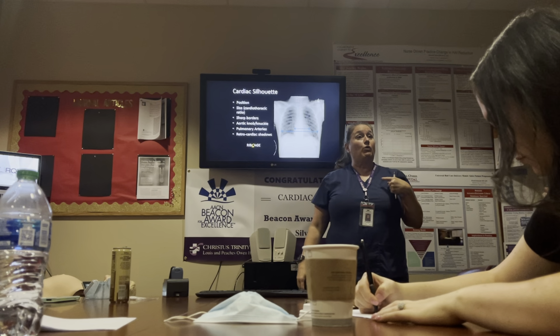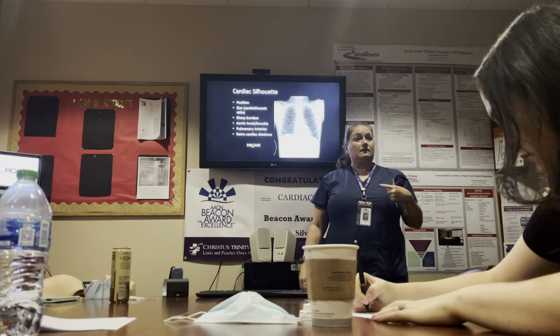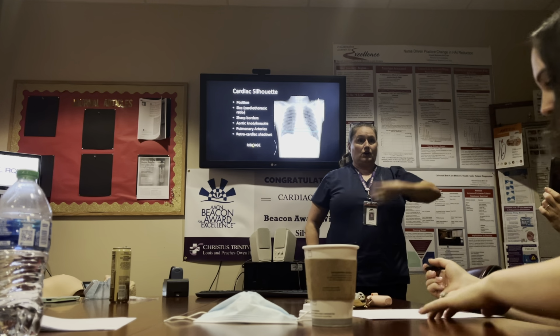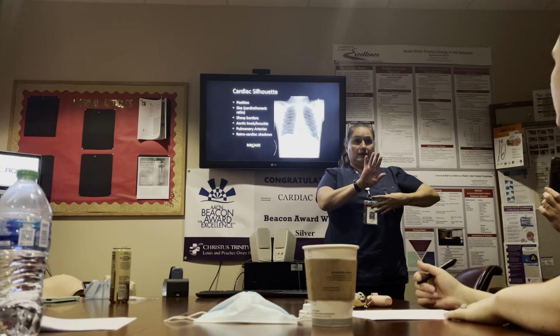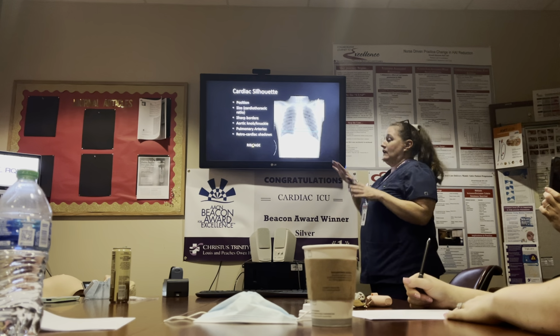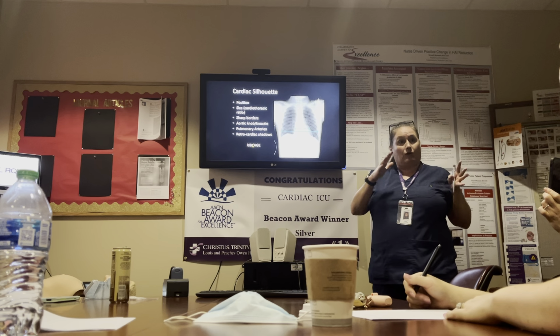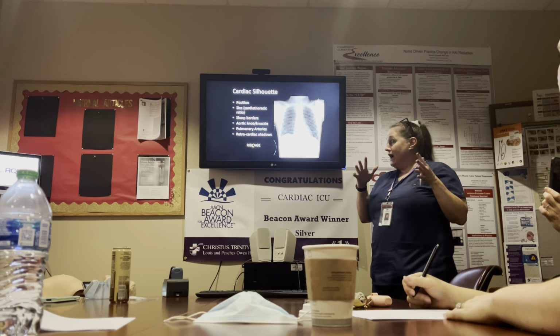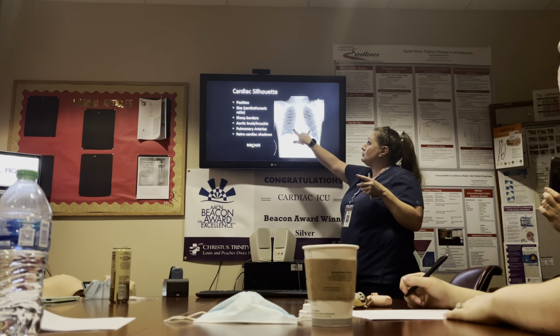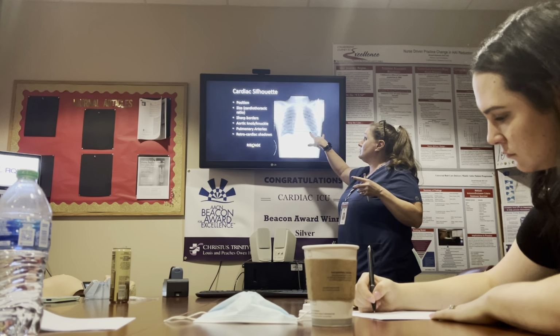When you take a regular chest x-ray, PA and lateral in the department, the plate is here and the patient is standing up against the plate, so the beam is coming from the back, okay? So it'll look a little different. The chest will look a little bit more compressed and the cardiac silhouette can be a little bit more wide from that aspect. But it's usually going to be about 1/3 of the chest in size compared to 2/3.